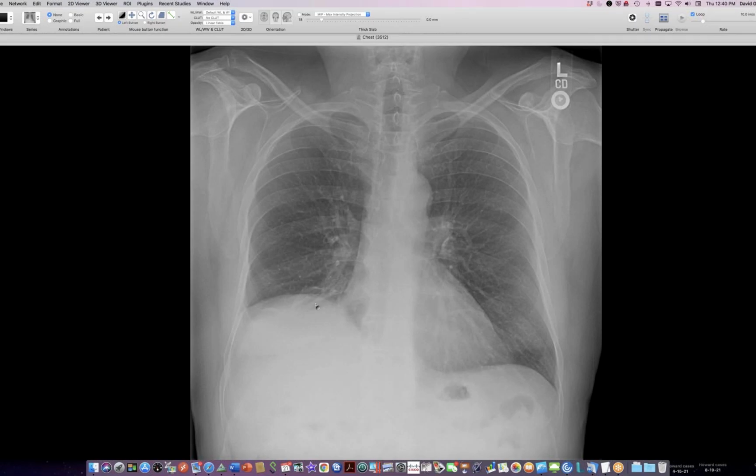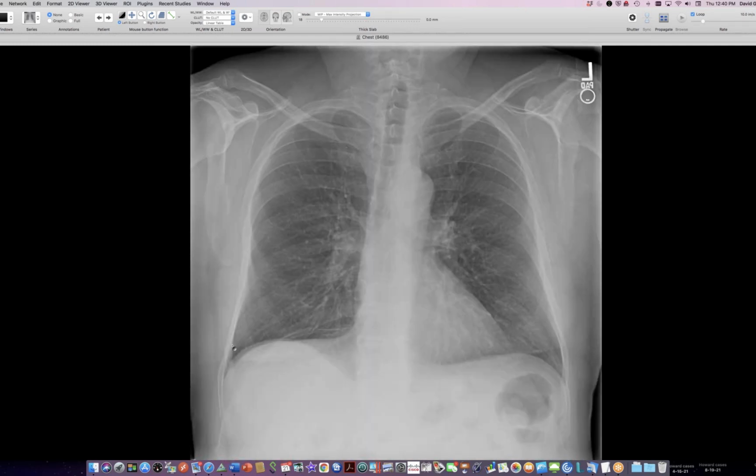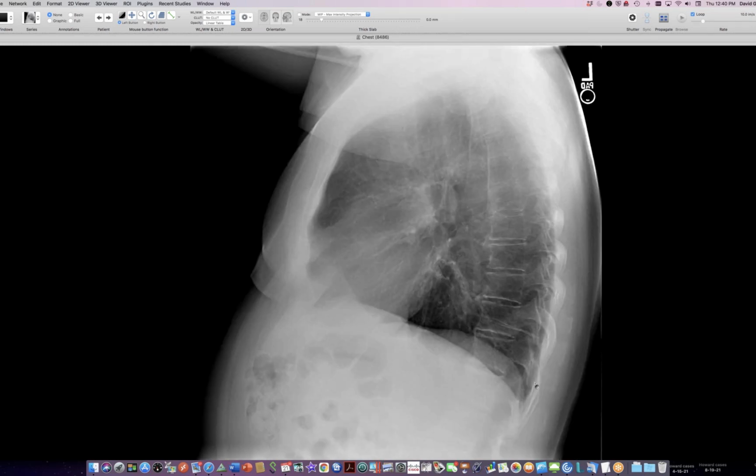So here is, let me show you radiographs on this guy. This is an early radiograph on the same guy we've just been talking about. Notice that once again, the elevation goes all the way posteriorly, unlike eventration where it will dive posteriorly to get back to normal height. It stays elevated all the way back. That's great for paralysis or at least weakness. And then the current radiographs show restoration of normal height of the right hemidiaphragm. And on lateral view, everything's down at the same level.